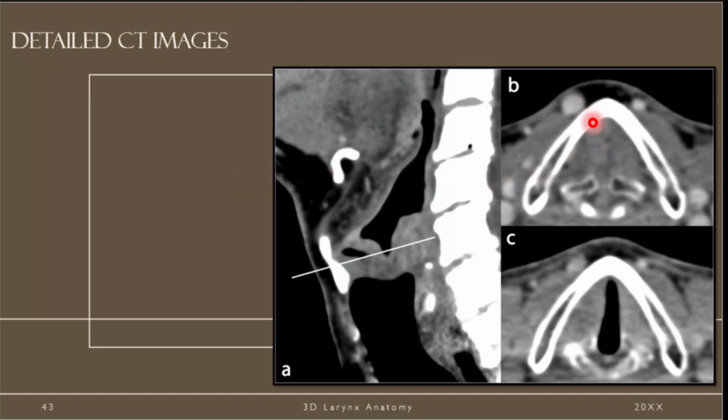This is a patient who tried to hold his breath during the examination. You can see the approximation of the two true vocal cords. How do we know that? We have the arytenoid cartilage. Anterior to it, this is the true vocal cord, but the patient held his breath while being examined, so the two vocal cords were opposed together. We had to re-examine the patient to try to separate the true vocal cords from each other.